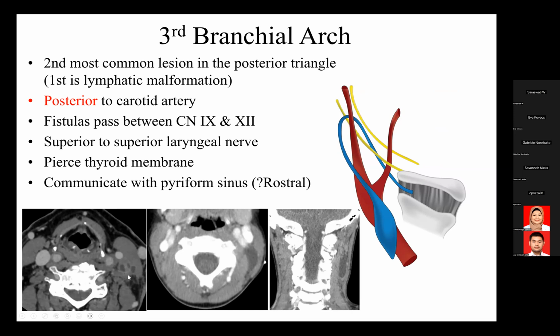So I remember this case right here. This was an older kid. This was an adolescent. We saw this. Again, I was worried about things like tuberculosis, metastases, et cetera. But this was pathologically proven third branchial anomaly.